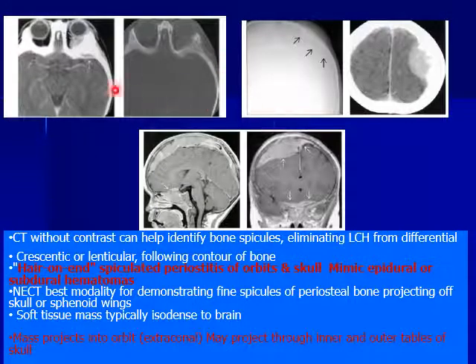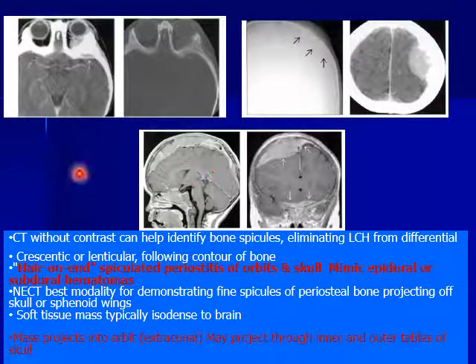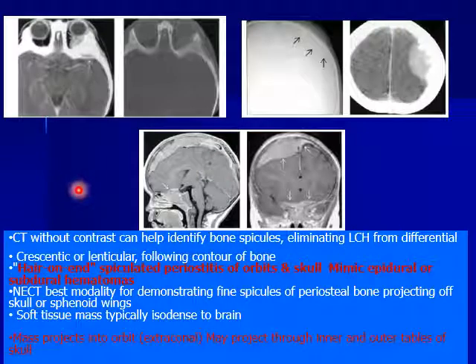So consider if you see masses like this in a child with the specific hair on end periosteal reaction like this and like this, you should think to go to do ultrasound for the abdomen to detect a neuroblastoma lesion. Okay?